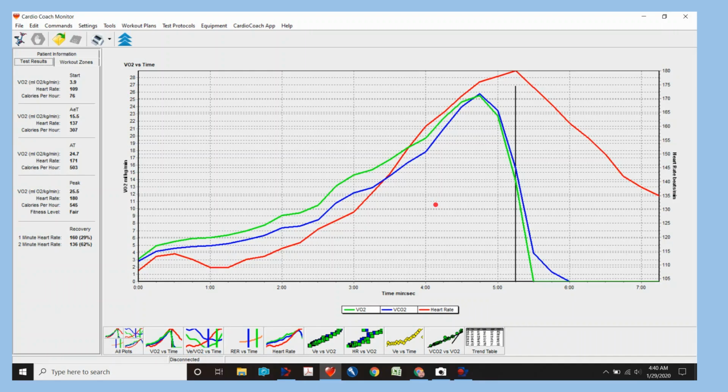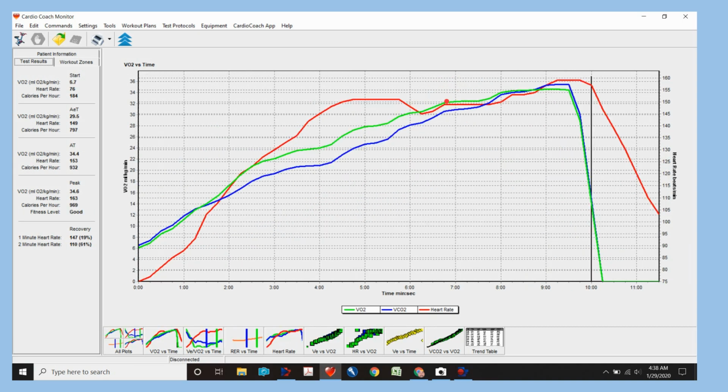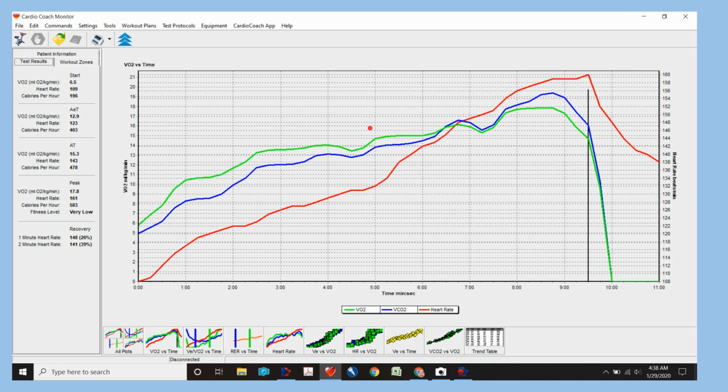So this type of test right here, if we were to score this test, how many points out of 5? We'd probably only give it 1 or 2. It's not a good test. The previous one to that, again, 1 or 2 points. That's not what we're looking for. This one, maybe 2 points, but it still jeopardizes the information.